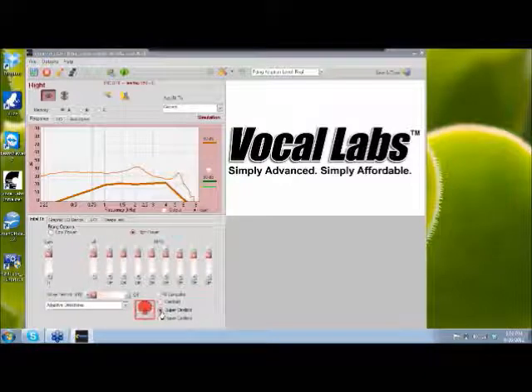Supercardioid is kind of a middle of the road. This is what we recommend to start off with. For spatial recognition reasons, it gives you a little bit of sound behind the head. The hypercardioid plot, believe it or not, is one of the better plots for a really noisy environment or like a loud party type environment. The way that the compression works together and the directional microphones adjust, it actually is the most recommended setting for a very noisy environment. But to start the patient out with, start on the supercardioid.